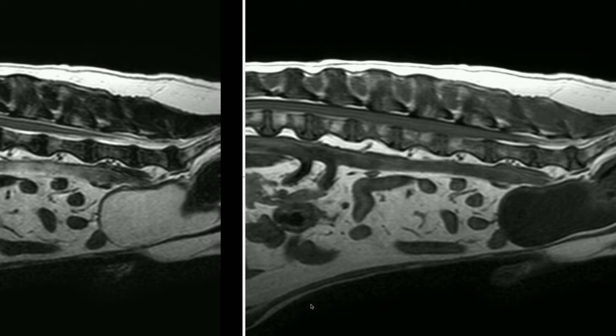the neuroforamina, muscles, etc. In these cases, often I personally would like a dorsal STIR or fat suppressed T2 weighted image, which you don't have in this case. The reason being that when lameness is the main sign, the dorsal plane is a really nice study for assessing non-neurological structures such as the sacroiliac joints, hip, paravertebral muscles, etc.